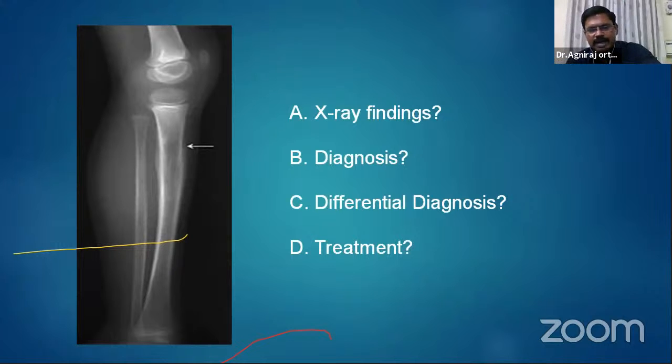So main differential diagnosis is osteomyelitis. Second differential diagnosis is osteosarcoma. The only thing against osteosarcoma is it is a diaphyseal lesion. Osteosarcoma, you should read about the subtypes. Subtypes there are osteoblastic, chondroblastic, fibroblastic, telangiectatic. So all types of lesions are there: lytic lesion, sclerotic lesion, lytic mixed with sclerotic. All the types you can see in osteosarcoma. Okay, Ewing sarcoma diagnosis accepted.